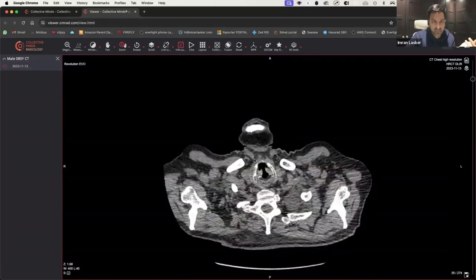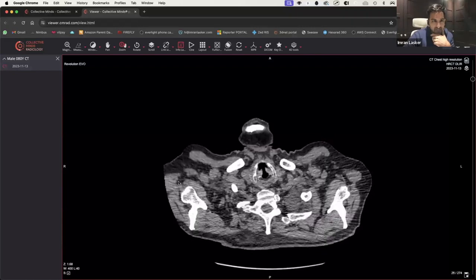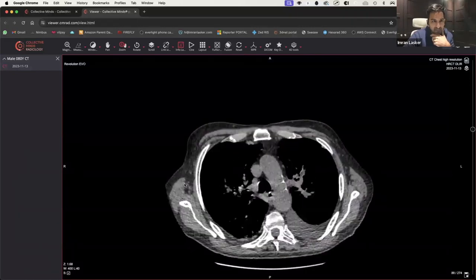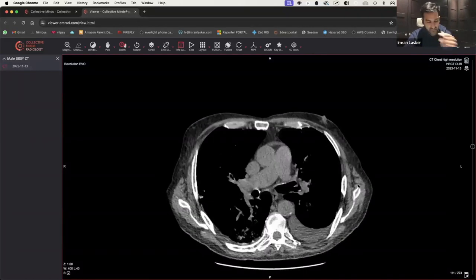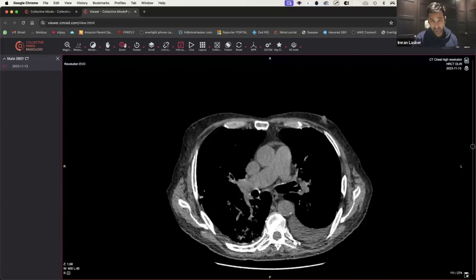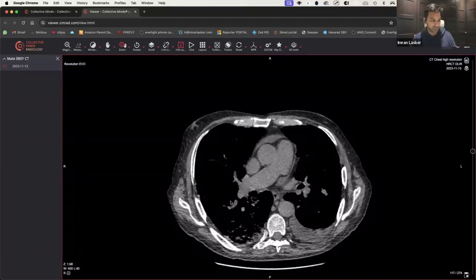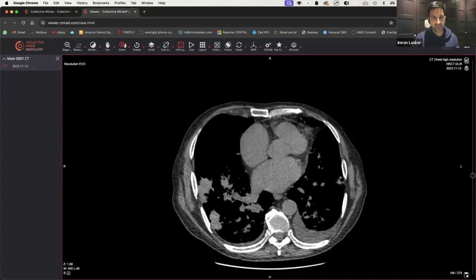So supraclavicular wise, the thyroid may be slightly enlarged, but not much else is going on. The axilla doesn't look like it has anything else going on either. There are no enlarged lymph nodes. You'd be looking for lymph nodes in the armpits over here. Someone said it could be metastatic disease. Yes, it could be, but I don't think we can convincingly say we've got a focal primary, because the primary would usually be the big, very obvious one, and then you'd have all these small ones. So we've got to still think about what else it could be.